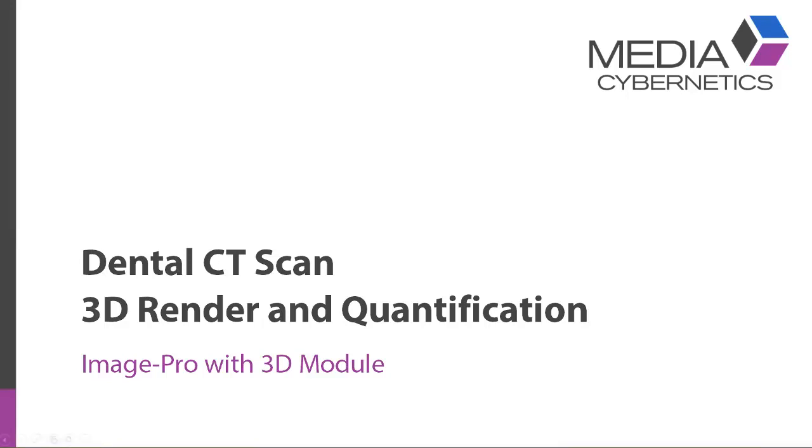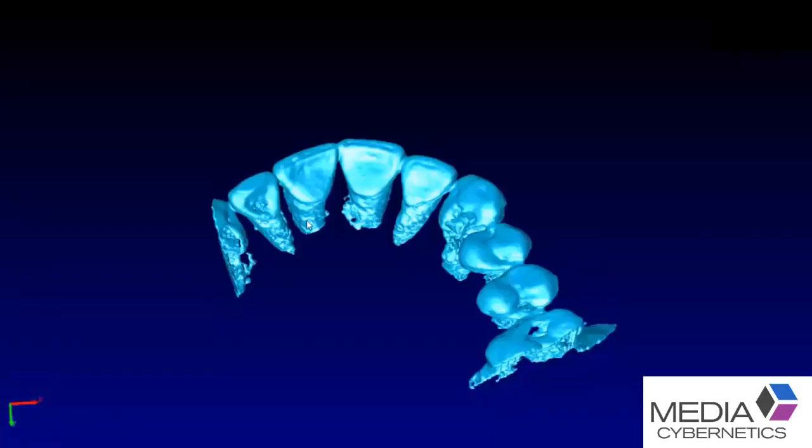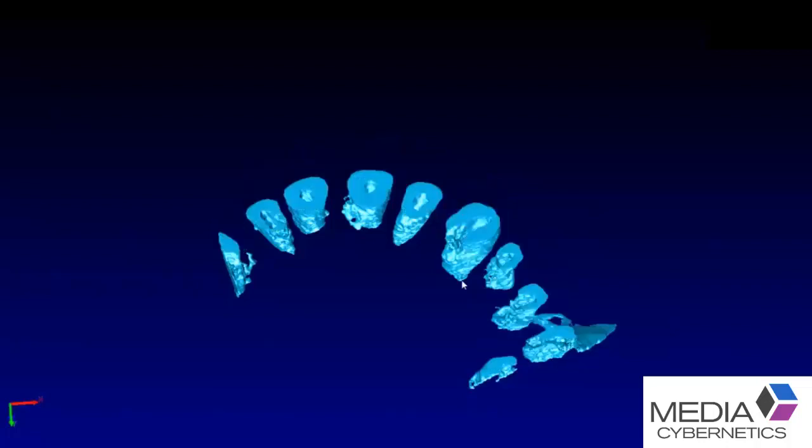I have a 3D presentation here specifically from one of our great researchers down in the great state of Texas. This was dental teeth contained in the mandibular joint in the bone, and it was 3D rendered via the CT scan. This example shows the lower teeth in the lower jaw, and that's one view.